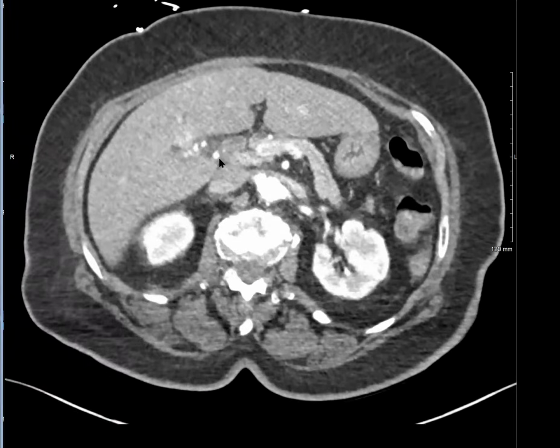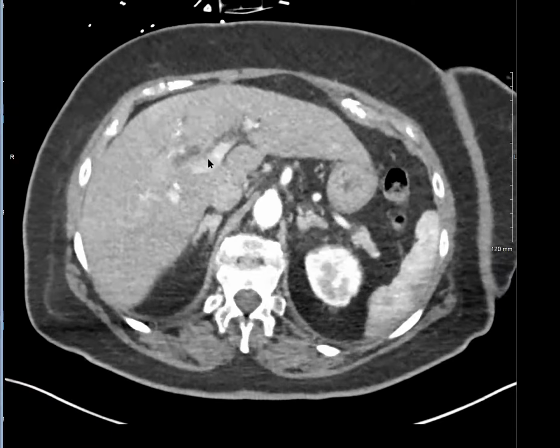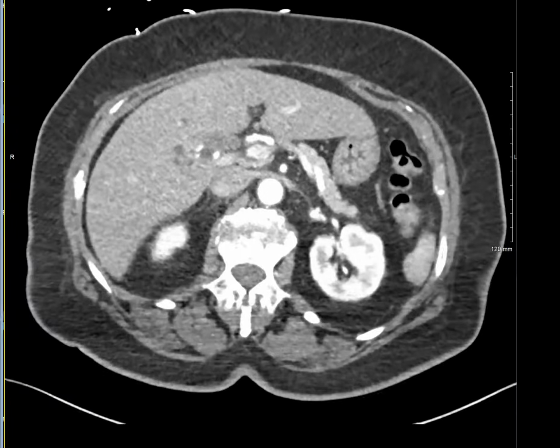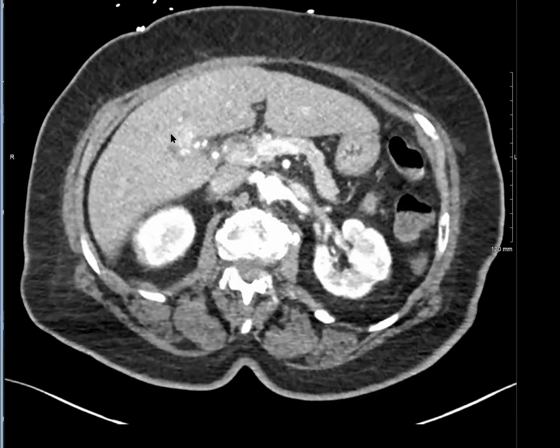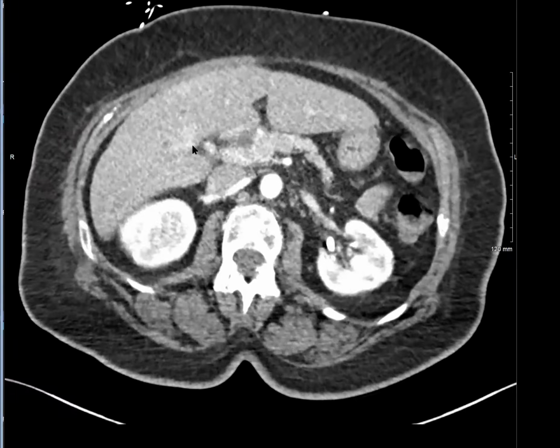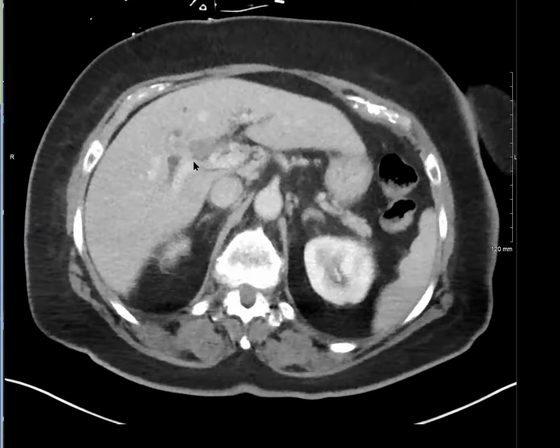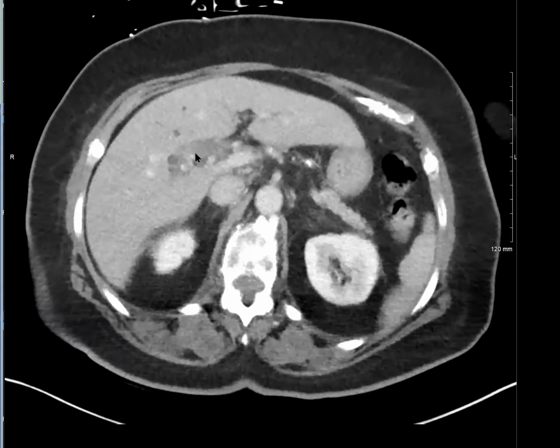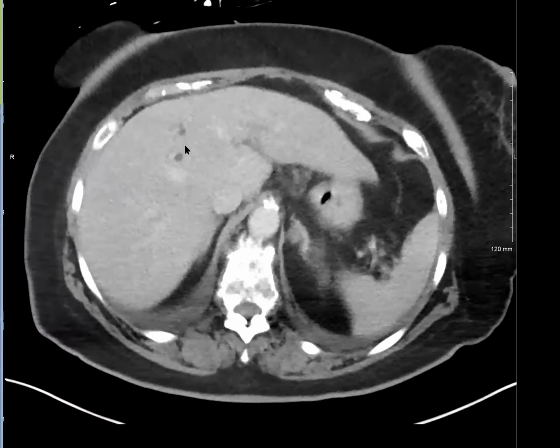True. So if you look carefully at the arterial phase, here are the bile ducts. Let me window it. I don't know if you can see this. So if you can see, there is this focal arterial hyperenhancing rounded lesion, and then that seems to extend into the bile ducts. You can see that finding better on the portal venous phase here. So that is the duct. There's soft tissue within the duct. On the portal venous phase, it slightly washes out. I'm giving you the right clues.